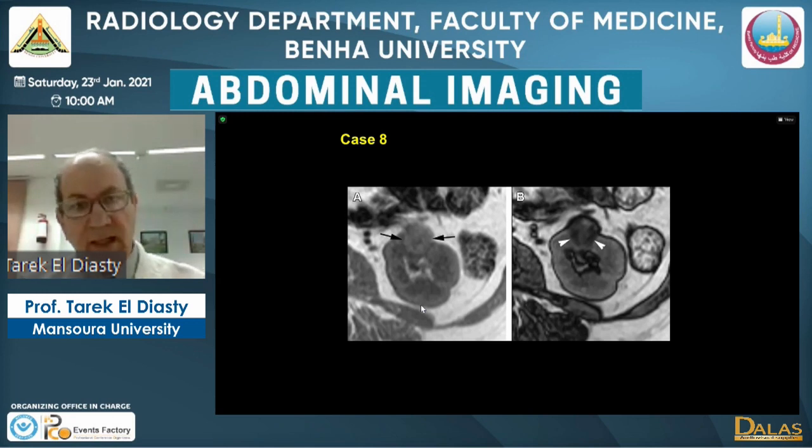Again, many answers were that it is angiomyolipoma, but that is a wrong answer, because angiomyolipoma does not show the drop of signal on the out-of-phase image. The chemical shift image shows that the lesion contains intracellular lipid, but in angiomyolipoma, this is fat cells or macroscopic fat, not intracellular lipid. So this drop of signal is characteristic of clear cell renal cell carcinoma.